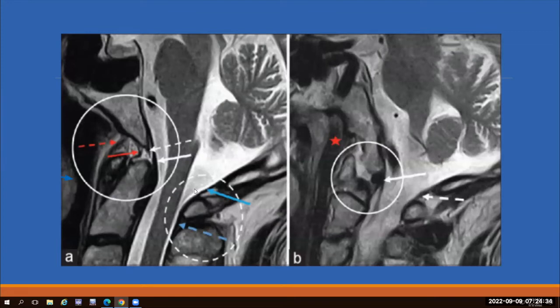And it's basically the same as that cartoon diagram we already showed. So this is showing you the position of the anterior Atlanto-Occipital membrane. Then that continues down as the anterior Atlanto-axial membrane. That's the normal appearance. Here is our nice little apical ligament within our supradental space. On this patient, you can actually see the little superior band, superior longitudinal fibers of that cruciform ligament. Posterior to that, we have our tectorial membrane, which inserts up here and comes down and forms a sling posterior to C2.